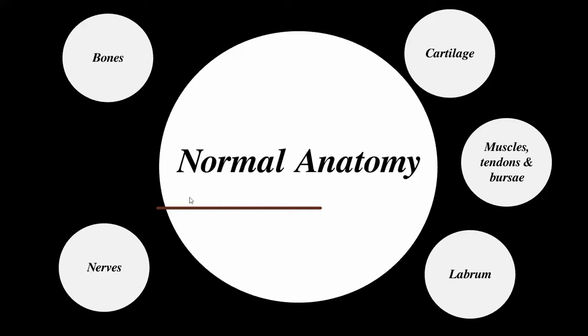Another issue with imaging the hip joint is that it's difficult to image because it's not orientated in the standard axial, coronal and sagittal planes of the body. It's oblique, slightly angled, and there's significant variation in hip joint orientation from person to person. X-rays and CT are good for bone. Ultrasound is good for intervening in the hip, directing and visualizing your needle. But we are going to look at the individual structures that make up the hip joint on MRI.